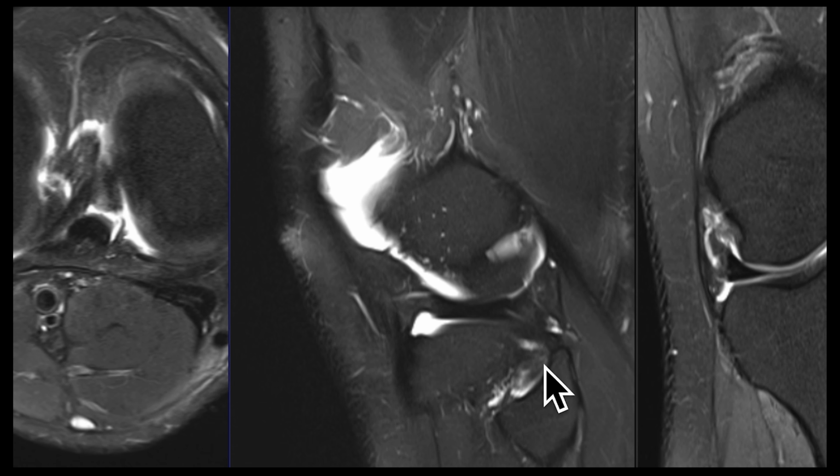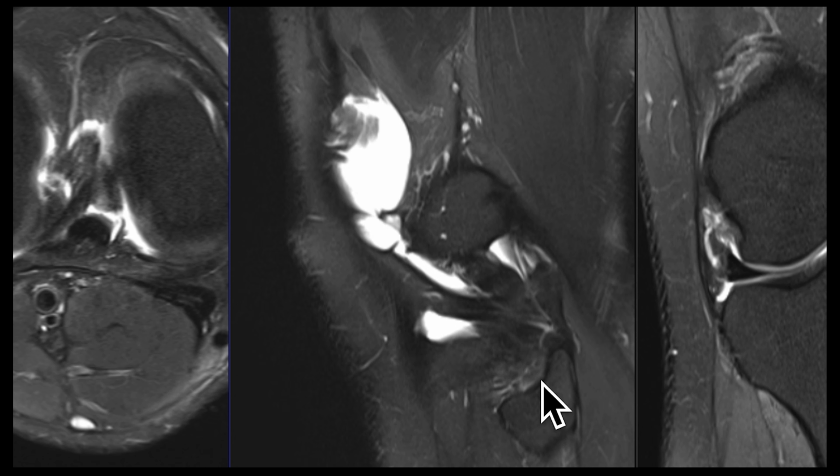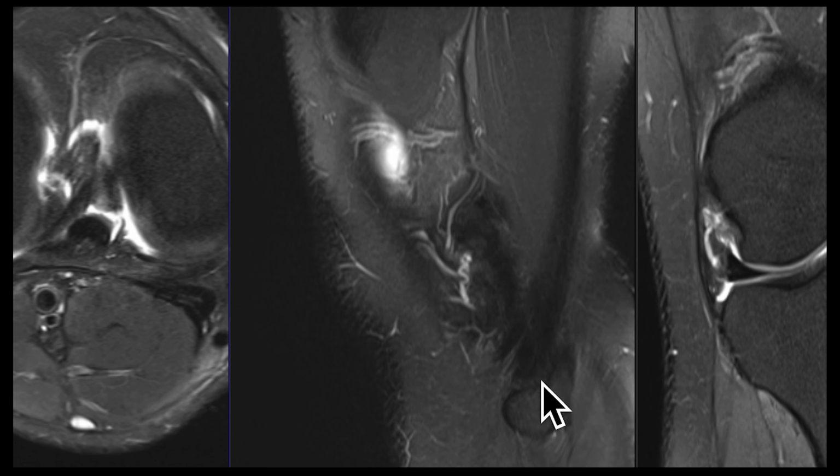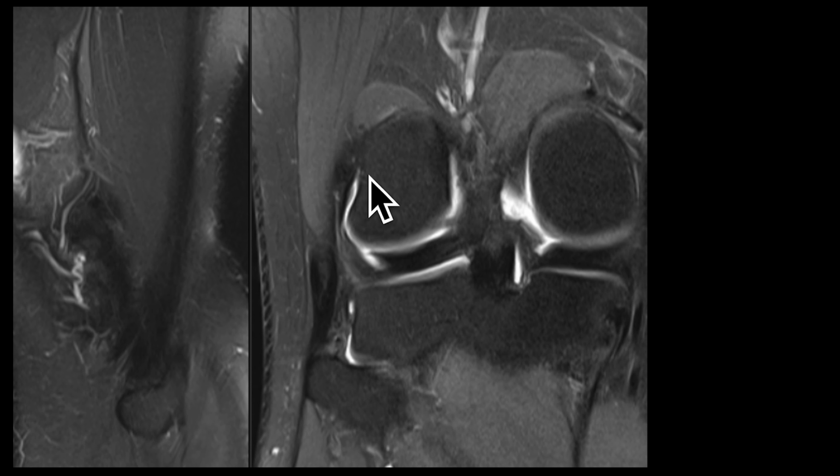You can see the same anatomy here. So here's the fibula head, and if we look, the structure which extends from a muscle belly down here is going to be the biceps femoris tendon. And if you scroll through a little bit more, you can see this vague outline here of the fibular collateral ligament if you think about partial voluming. So this V-shaped anatomy here is a normal appearance of the conjoint tendon, which is made up of the biceps femoris and fibular collateral ligaments. On the coronal images, again, you'll see that here.